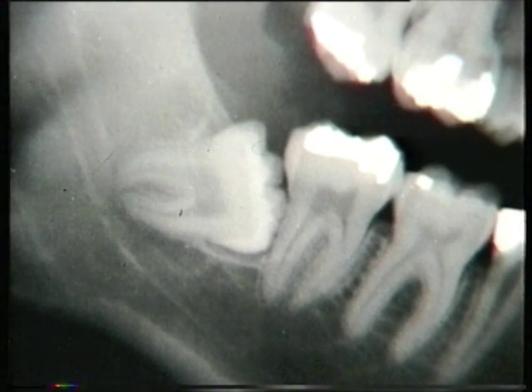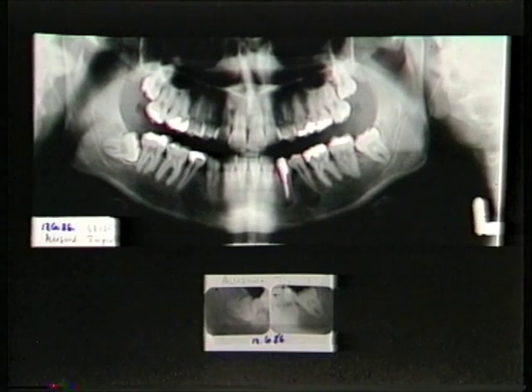The other relationship of which we need to be aware is that of the inferior alveolar nerve. On the periapical, the outline of the canal is lost at the mesial root apex, and the lower third of the mesial root lies along the upper border of the canal, so the relationship here is very close. No gross abnormality can be seen within the bone of the mandible on the orthopantomogram, and this seems to be confirmed by the periapical.